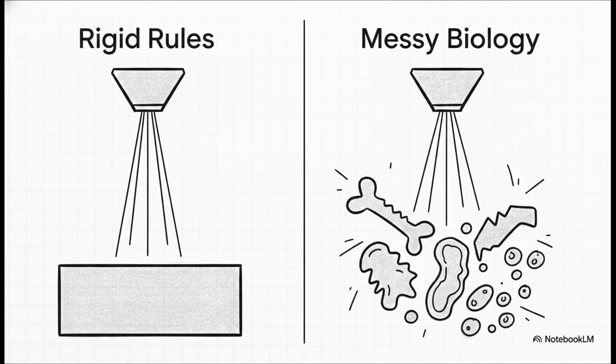Okay, let's take a closer look at these theoretical rules the machine operates by. The ultrasound's entire brain is built on a few core assumptions. First, it assumes that ultrasound waves always travel out and back in perfectly straight lines. Second, it assumes the beam is always this constant, narrow width. Third, it firmly believes that every single time sound hits a tissue boundary, it generates just one neat, single reflection.